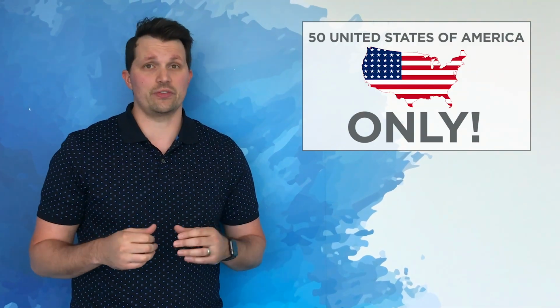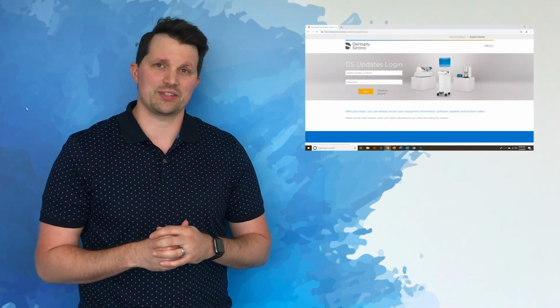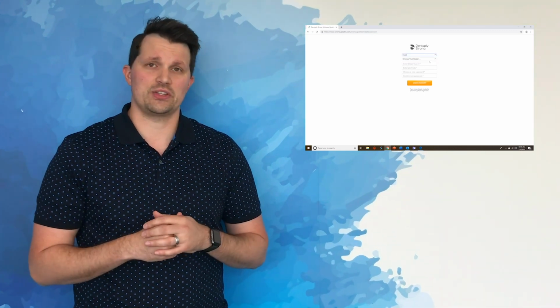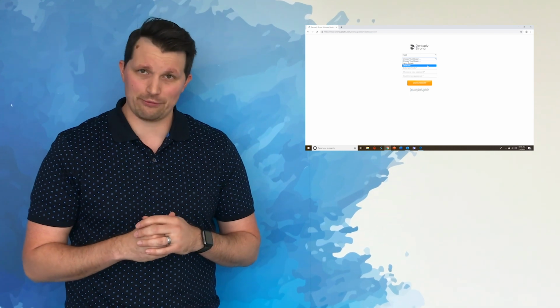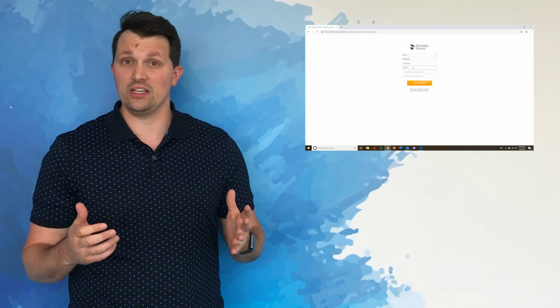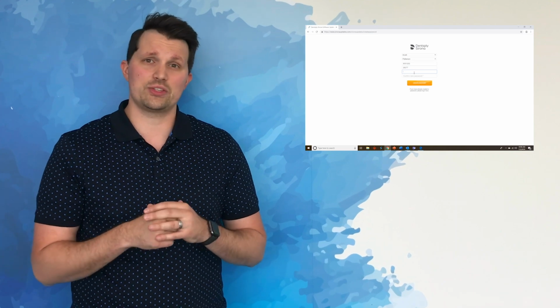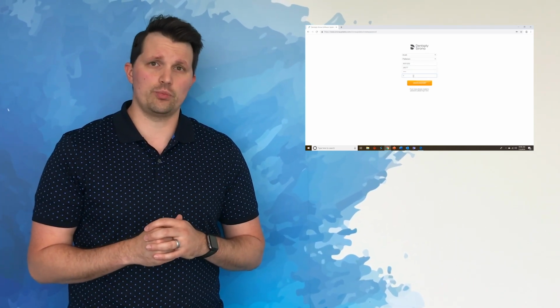So, the new process for inLab Software 19, we are excited to say that we have automated this process. All of the license keys that you normally would receive from Dentsply Sirona, which was done manually, will now be done using our inLab Updates platform. How this process will work is that those who had registered for inLab Software 16 or inLab Software 18 in the past will automatically be rolled into this new process. So what we're going to do is take a first-hand look at what this new process looks like.